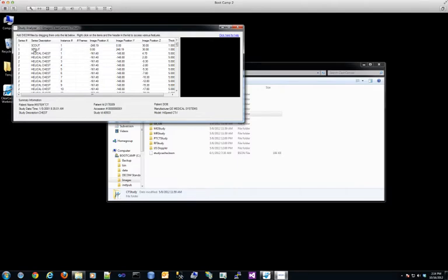A couple of things you'll see on the screen here is a summary of the information down here. As we know, each DICOM file can have the patient name and study level attributes in it. They're replicated through each file. This will pull basically the first one out and display it. So if you have more than one patient in a folder, it won't indicate that. It assumes you're really working with a single study or a single patient at a time when it comes to this information. So you'll see a quick summary of what's there.